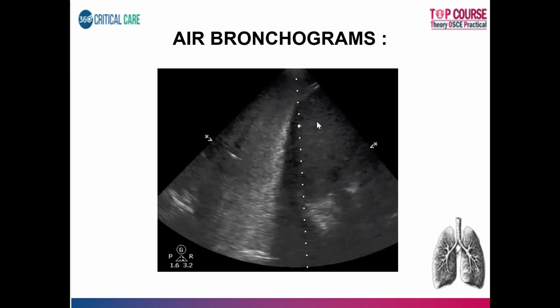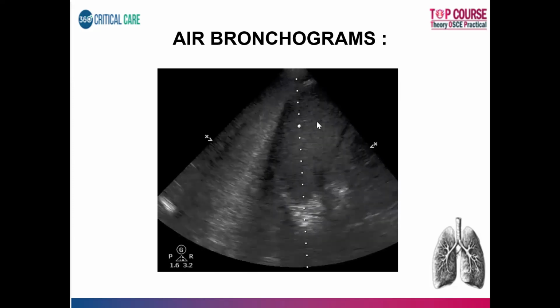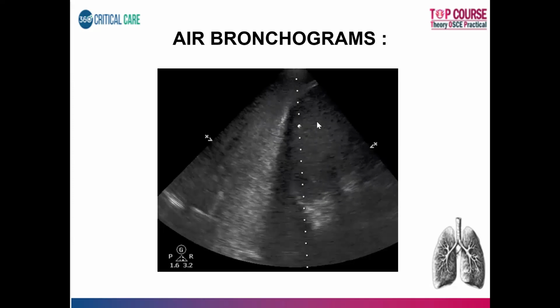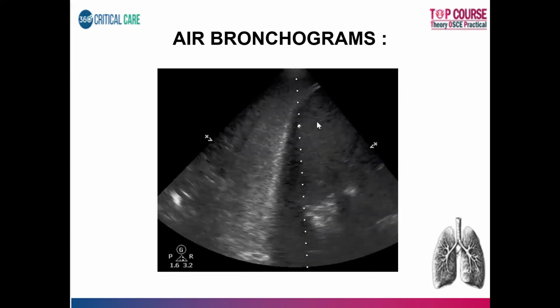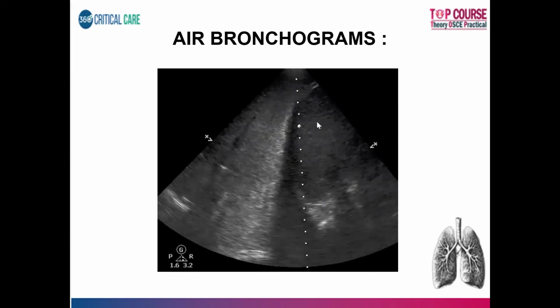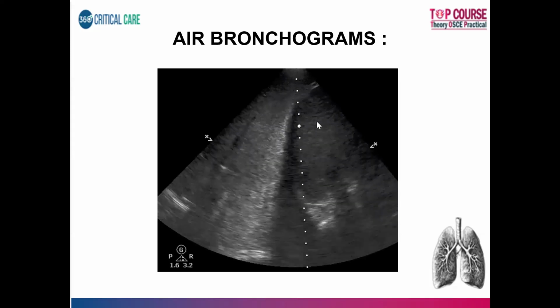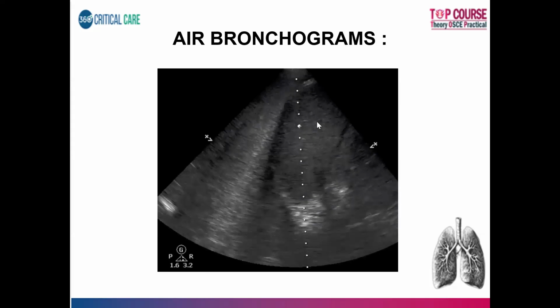By and large, there are a lot of newer lung ultrasound pathologies which are coming based on the air bronchogram picture. They're also doing studies on extended lung ultrasound. When we're doing extended lung ultrasound, there will usually be a heterogeneous lung pathology, right? Some part of the lung will have consolidation, some part of the lung will have atelectasis. So how do we differentiate? That is always a question that we have. Only dynamic versus static air bronchogram cannot give us an answer there. So there are certain other protocols that look at perfusion along with air bronchograms and the lung slide. Along with that, there's a stepwise approach wherein we can tell that this part of the lung is consolidated, this part of the lung is atelectatic or collapsed. This is the reason that we need to know about air bronchograms. Okay, good.